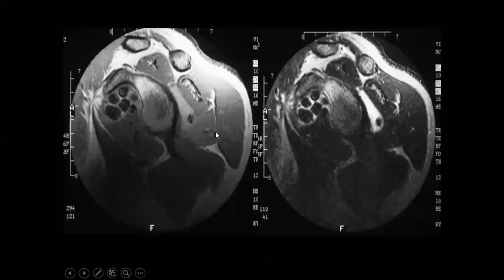I think this is one of the lovely cases that everyone, when he finds these borders, will like. First of all, which image plane is it? Is it sagittal, coronal, or axial? Yes?